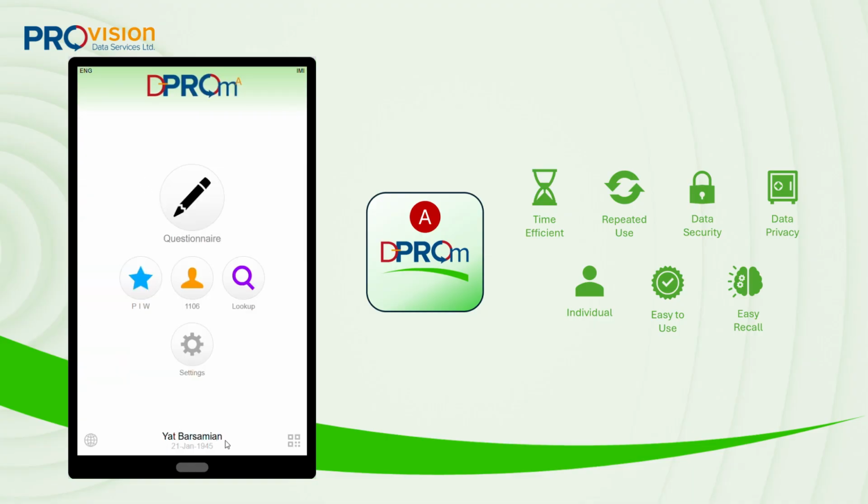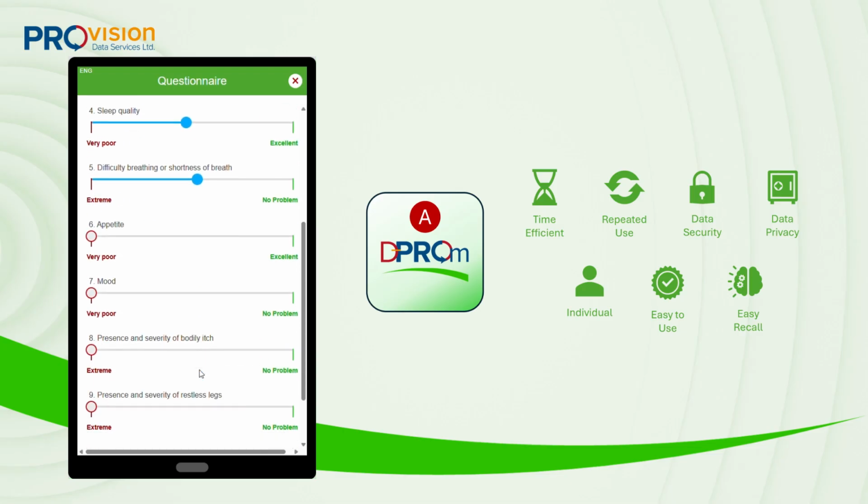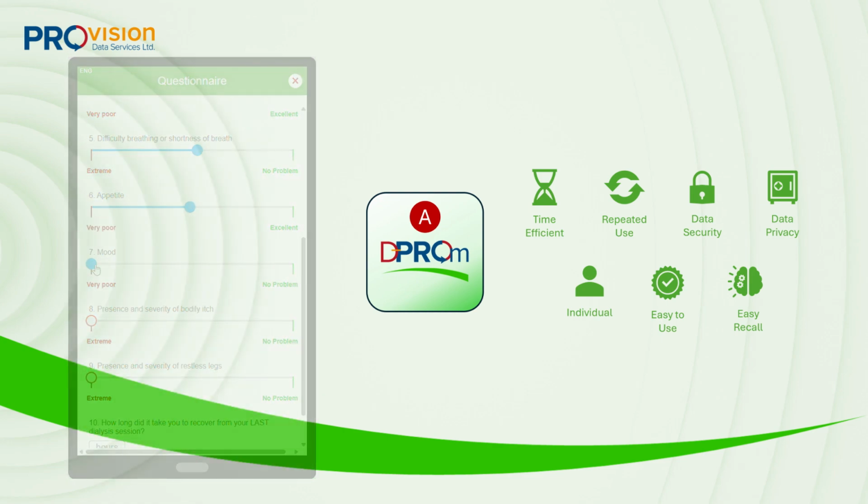Before we begin, confirm two things. The administrator is signed into PROview and can operate the interface, and the clinician has a smart device with a working camera ready. At the conclusion of this guidance, the D-PROm Assisted app will be available on the smart device's home screen and ready to capture patient insights.